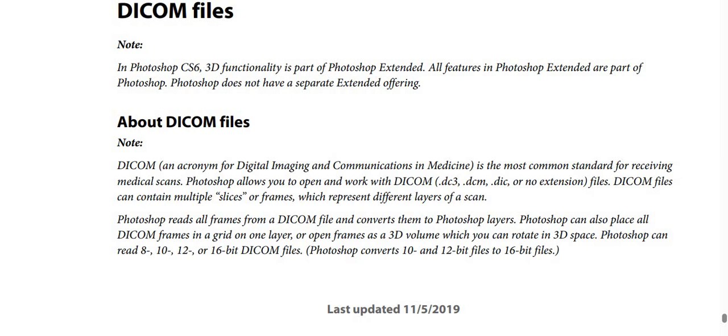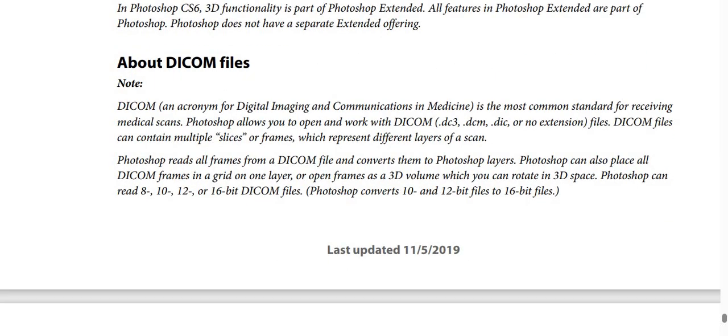So what about DICOM files? Note here please now. DICOM, an acronym for Digital Imaging and Communications in Medicine, is the most common standard for receiving medical scans. And Photoshop allows you to open and work with DICOM files, like .dc3, .dcm, .dic, or no extension only.